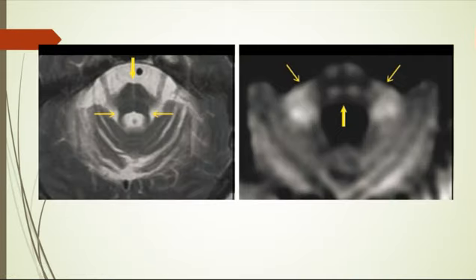So, what do we have here? It's an easy one. Okay. Tooth sign. What kind of tooth? Incisor tooth, canine tooth, molar tooth sign. What's the diagnosis? Creutzfeldt-Jakob disease. No.